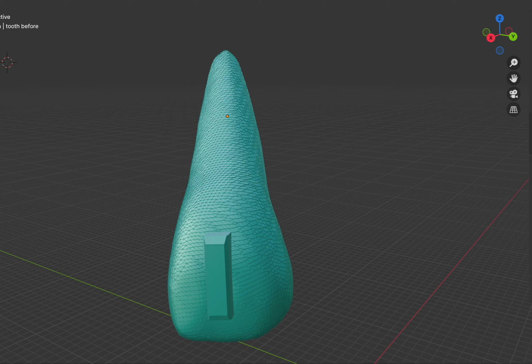Hi, here is a central incisor with an attachment bonded on the buccal surface, and the attachment has been beveled to reduce the stresses due to the interface between the aligner and the attachment, and we want to translate this tooth. Let's assume that's a left incisor distally.